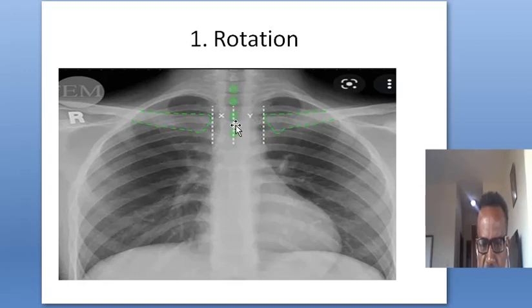So in this X-ray, the distance between the two medial clavicle ends up to the spinous process is almost nearly equal. So we can say this chest X-ray is slightly well centered, but there is some rotation on this side because the distance from midline to here is somewhat wider than the distance from here to here. Simply, y is greater than x. So these are important because it will make one of the hilum more marked.